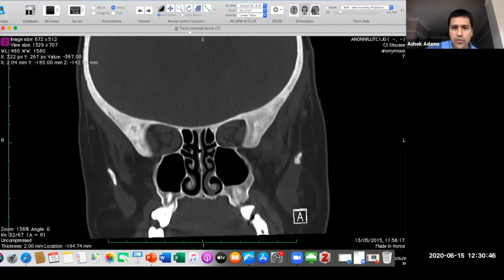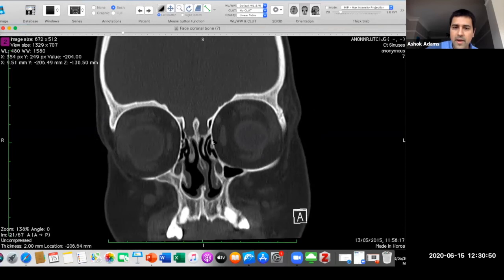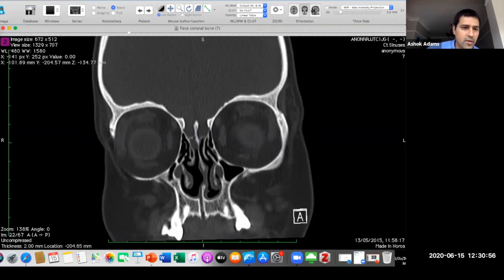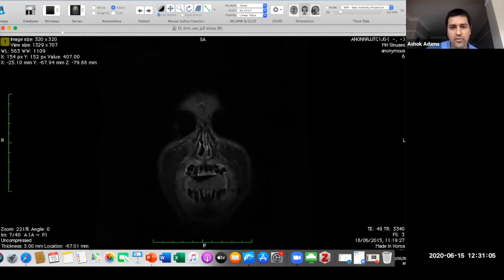This patient was slightly more robust, and they had papilledema and actually had idiopathic intracranial hypertension. And then if you're never sure about what this is, typically we will do an MR sinuses, and the key sequence with the MR sinus, if you get one sequence, is to look at the coronal T2 weighted sequence.